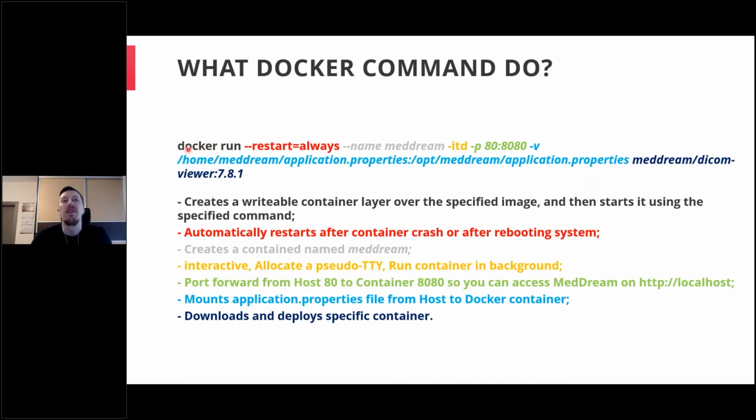So what this docker run means: it creates a writable container and starts the specified command with the attribute --restart always. It will automatically restart the container if it crashes, or after rebooting the system. --name will create the name of the container, MedDream. We add -itd to run the container in the background.